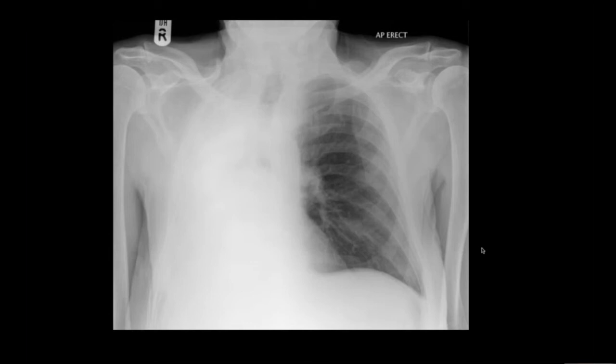So it's very important to compare if there is any previous remote chest X-ray or if this is already a known abnormality. And also look for any bone defects and surgical clips, as this may point towards pneumonectomy. But this can be easily clarified from the history taking.